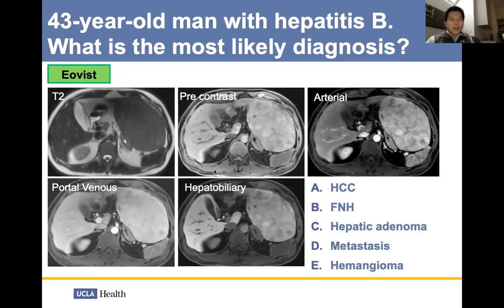So then we point out this lesion, and it has Eovist uptake. Okay, so there's enhancement. It becomes iso, so it could be, I mean, you can have green HCCs. A super indolent low grade HCC can take up Eovist, but that's not that common. I don't feel comfortable calling this an FNH. It's too heterogeneous to be FNH.